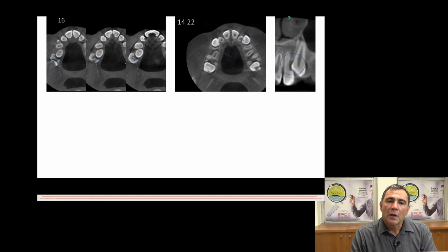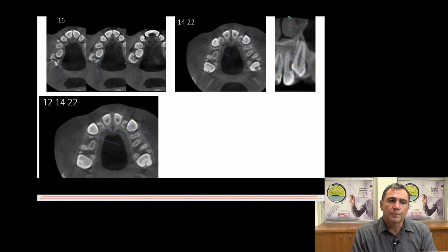And this is what the 2-2 looks like in a rotated view. Remember how I rotated the view? You can rotate it any way to make a tooth linear and perpendicular to the view that you want to look at. And remember, if you get lost, remember the round circle with the arrow, just press that and it will reorient you again to the levels that you want to be.